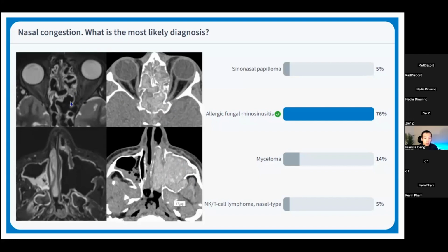And on the MRI, we see a complete lack of signal in here. This is due to mineralization that's collected by the fungi, and that causes signal dropout. It's also because this material is so devoid of water. It's very dried out. It's inspissated, like a peanut butter consistency.